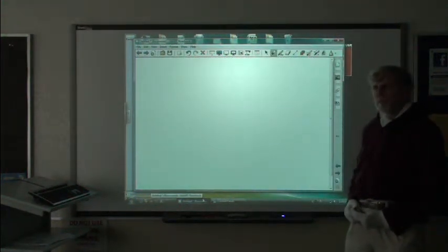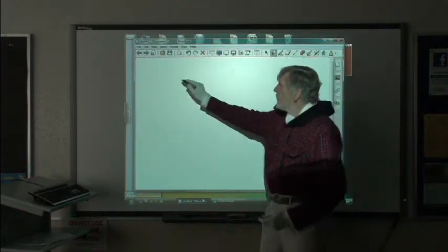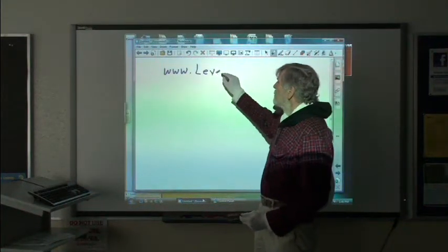If the name of the website, and it is, that I'm going to attach to, is www.levelfordiabetes.com, when I visit that website in my internet browser, I usually put in the name of the website in this fashion.